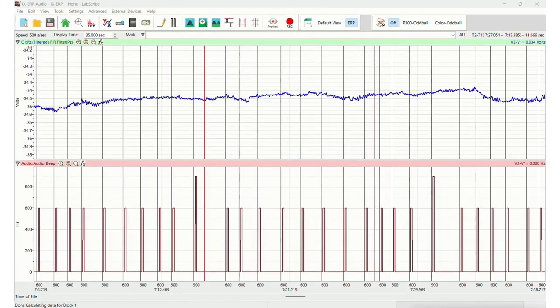The ERP Analysis Module is an add-on to LabScribe Software that is designed for studying event-related potentials, or ERPs. An ERP occurs in response to a specific stimulus, sensory, cognitive, or motor, and represents the time-locked average of EEG activity collected over many repeated trials. By averaging multiple responses to the same event, the module reduces the inherent noise present in EEG signals, allowing the stimulus-related potential to be clearly visualized and analyzed.